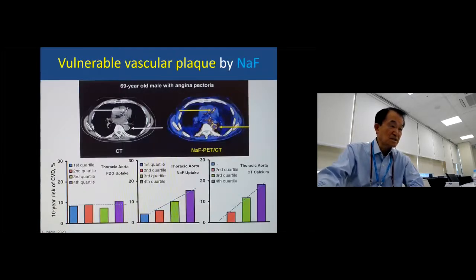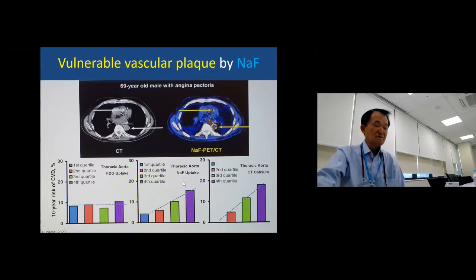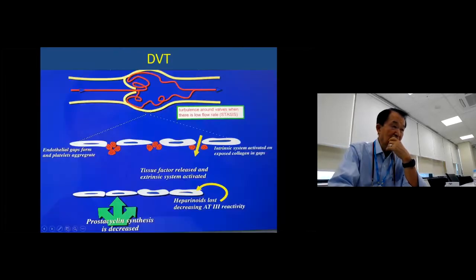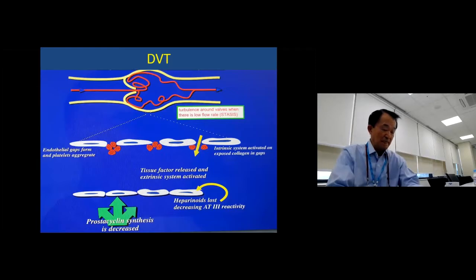So you can see here, we often see calcification in the wall, and some of it correlates with the sodium fluoride PET scan, and its quantification shows some relationship. Here in the anterior descending coronary artery, there is calcification.